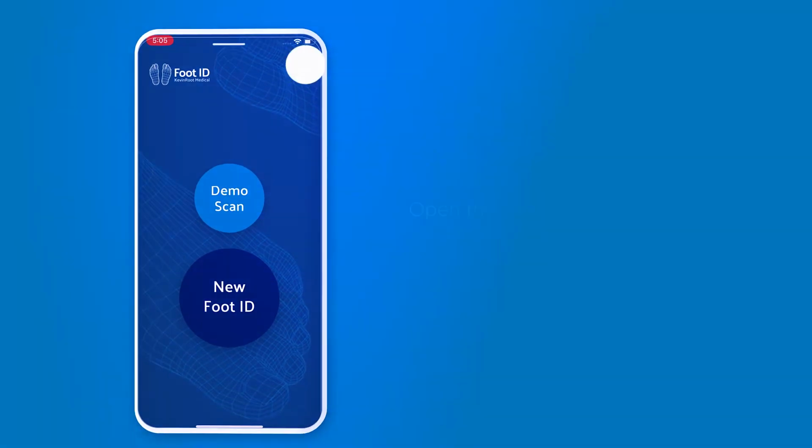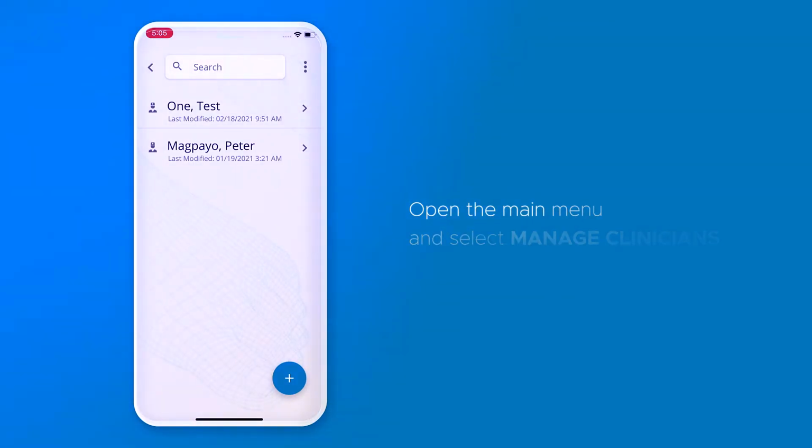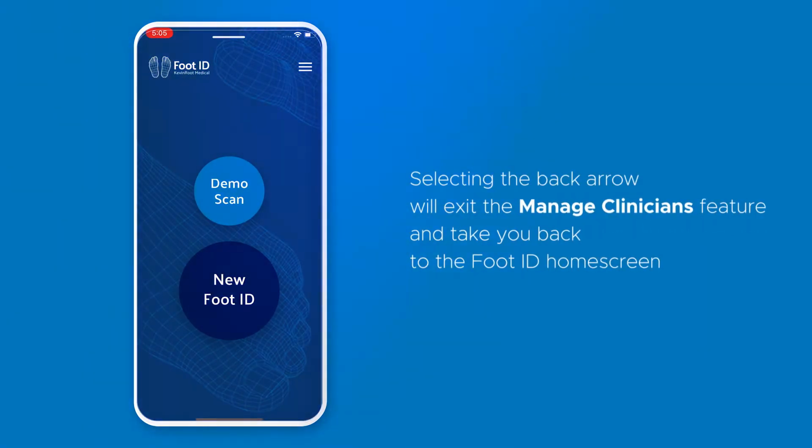From the home screen, open the main menu and select Manage Clinicians. This will take you to the Clinicians list screen. At the top of this screen, you'll see a back arrow at the top left. Selecting the back arrow will exit the Manage Clinicians feature and take you back to the Foot ID home screen.